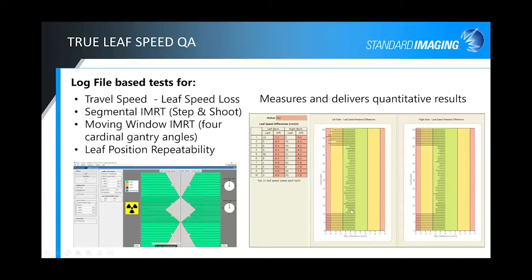You can see here, this is typical of a result of a system where you might see some errors on the outer leaves because you don't use those as much and they don't move as much. There might be some dust or some excess lubricant buildup that might slow them down. So this is pretty typical of what you see in a lot of situations.